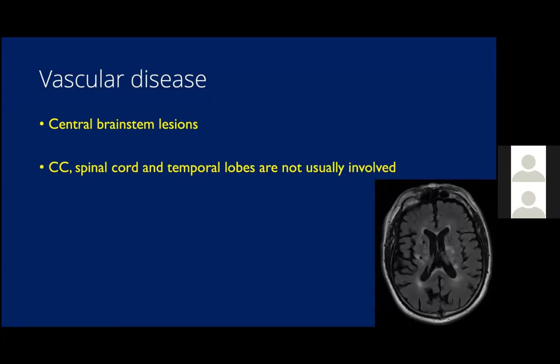Similarly, vascular disease does not involve the corpus callosum, the spinal cord, or the temporal lobes. They spare the subcortical U fibers, as opposed to ADEM, MS, or other demyelinating diseases, and they show no contrast enhancement.